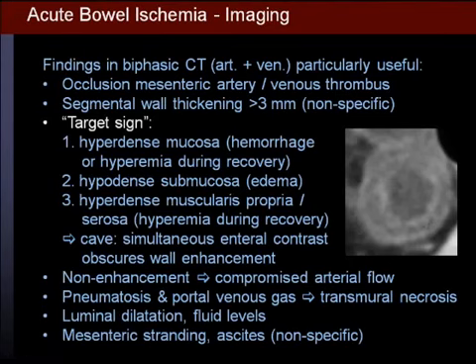which is hyperdense because of hemorrhage, blood clots in the mucosa, or because of recovery, again, contrast agent perfusing the area of the mucosa.